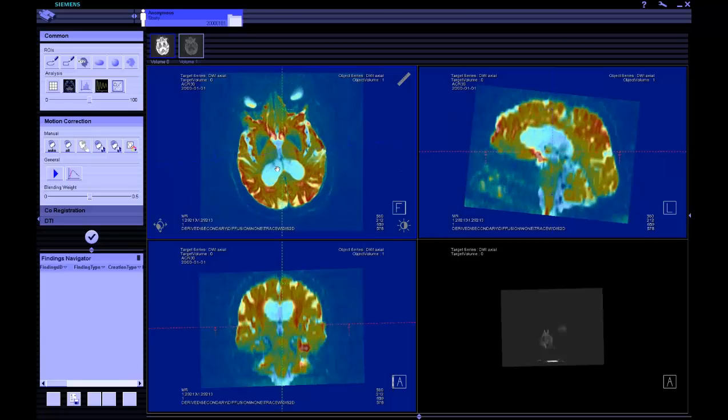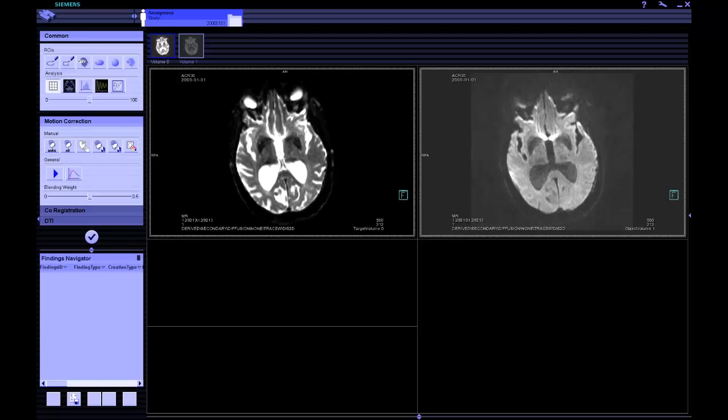And the key function of the prototype was, in case you have multiple DWI, multiple orientation, or multiple volumes of fMRI, to be able to do motion correction of those volumes and see the displacement across volumes. So in this case, we're not going to have that much to show. This is our B0, this is our average DWI.